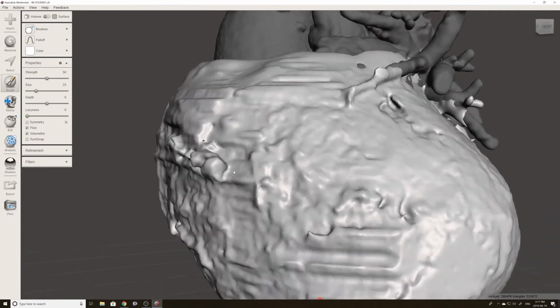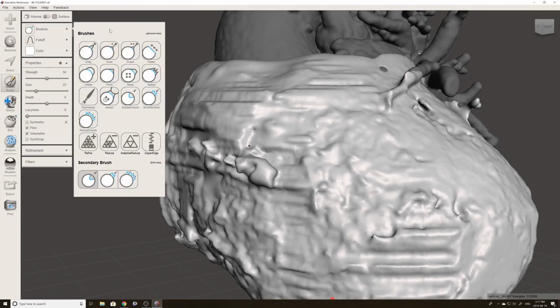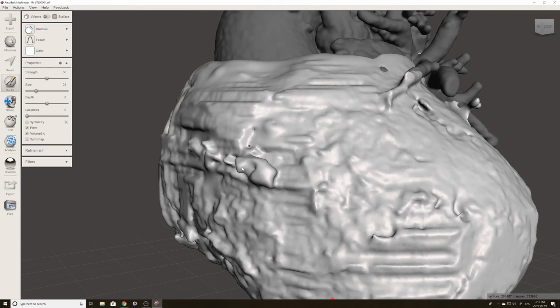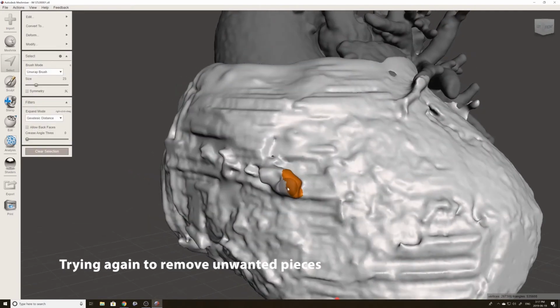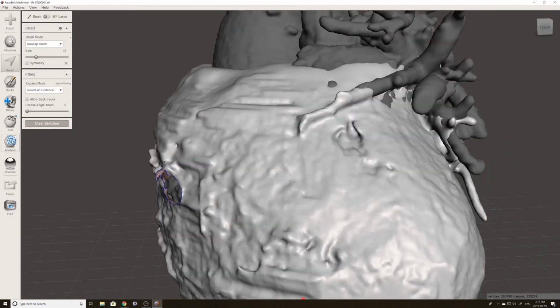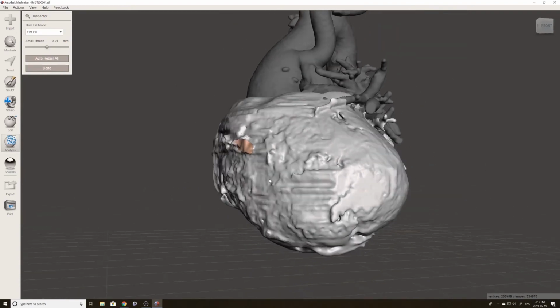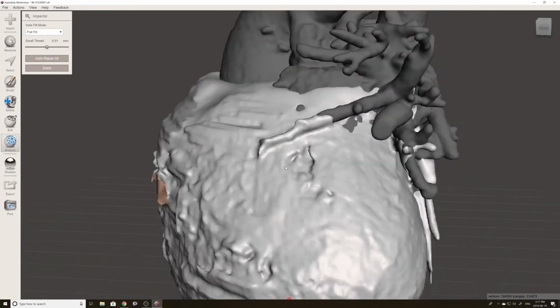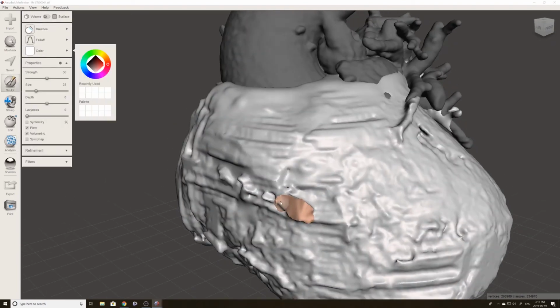Again, here we have some places on the scan where I think it got some bones, some ribs. I'm not exactly sure what it is, but you can either try to flatten that out, which might take a while because it is a fairly large area, or you can go through again with select, and this time it's going to work a little bit better with those auto repair tools in Inspector. So creating that hole again, I want to try to get rid of some of that area. So we're going to go into Inspector again, and whatever we have that has those little lines and the little balls at the end, that'll be a problem area. So it filled in our model, which actually did a really good job.